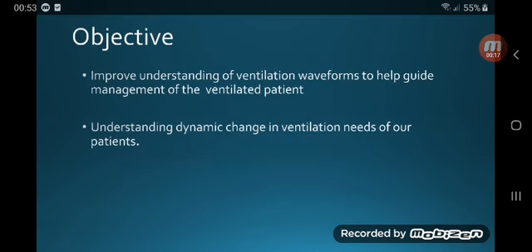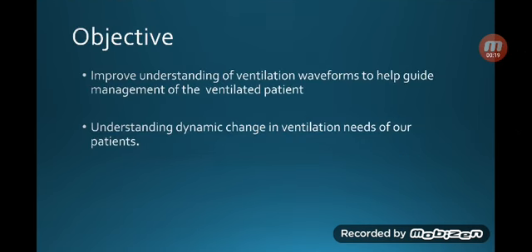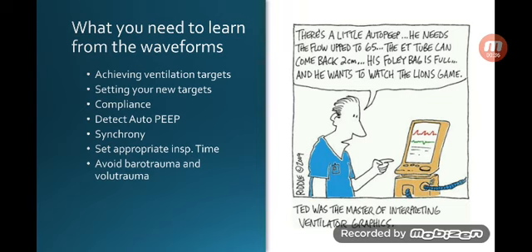We're trying to improve the understanding of ventilation waveforms for some of you who are not familiar with it, to help guide you in managing ventilated patients and understanding the dynamic change in ventilation, as they're not static statuses. What do we need to learn from our waveforms?